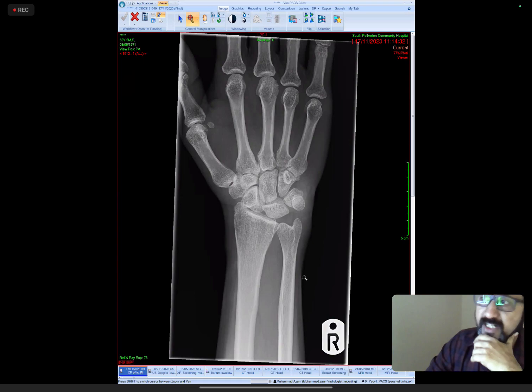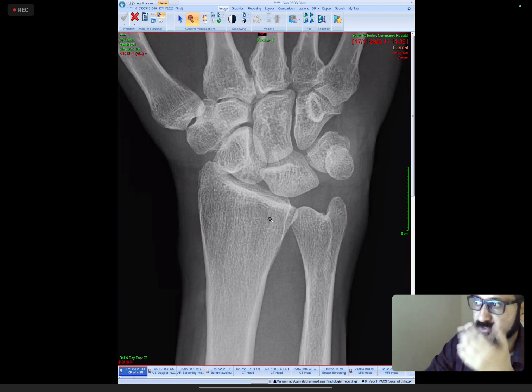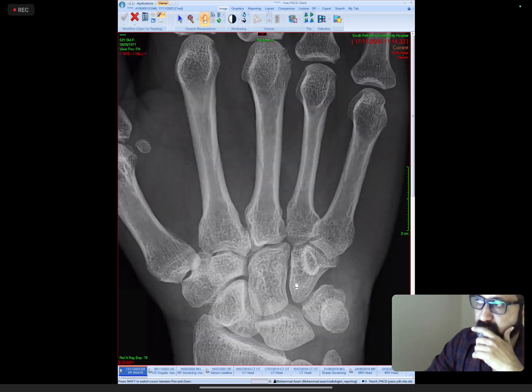So case number 8, that was so easy, a very obvious anterior dislocation. So I won't go over that case. And the RR10, that was a wrist. And someone wrote, I think, chauffeur's or something. That is again overcalling. There is nothing. Yes, if you wish to magnify, this is our fault that we can't magnify here. If there is some subtle lesion, then you would have an opportunity to magnify. But this is an absolutely normal wrist.